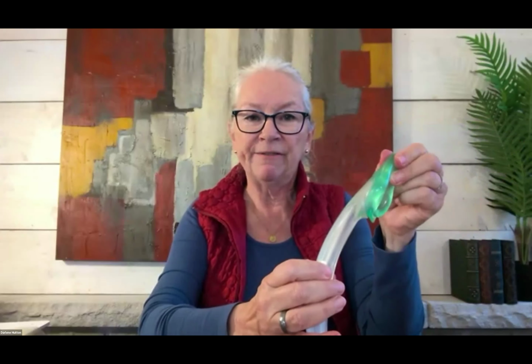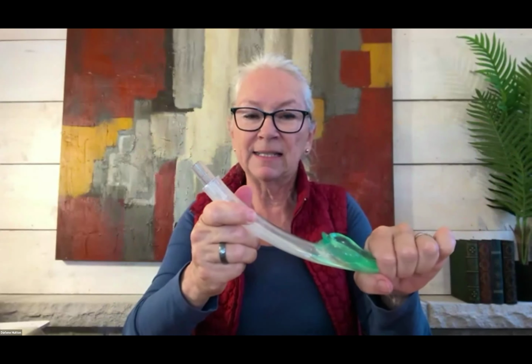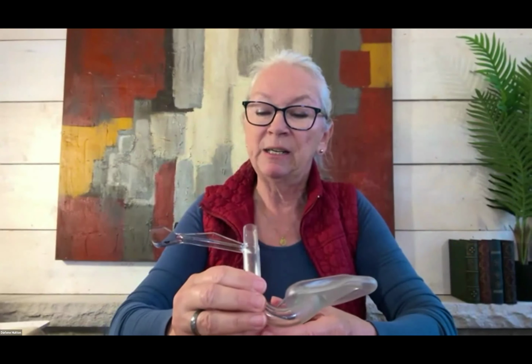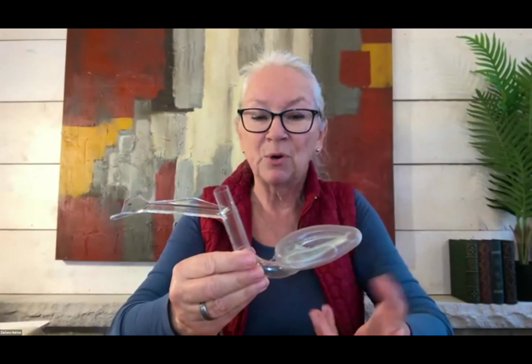Another example is the i-gel. The i-gel, as you can see, does not require inflation. So you would lubricate it, shove it in until it meets resistance because it's at the entrance of the esophagus, attach your Ambu bag, and the patient would have the air coming out here, going up the trachea into the lungs. Another example of laryngeal mask airway, this particular one is called a Fastrach. So different things that have been developed over time.